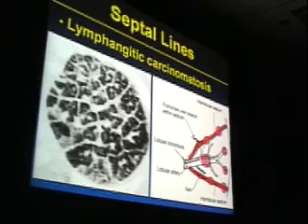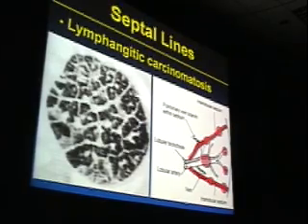Notice also that we don't have much in the way of a gravity-dependent distribution of septal thickening. The septa are just as prominent anteriorly as they are posteriorly.